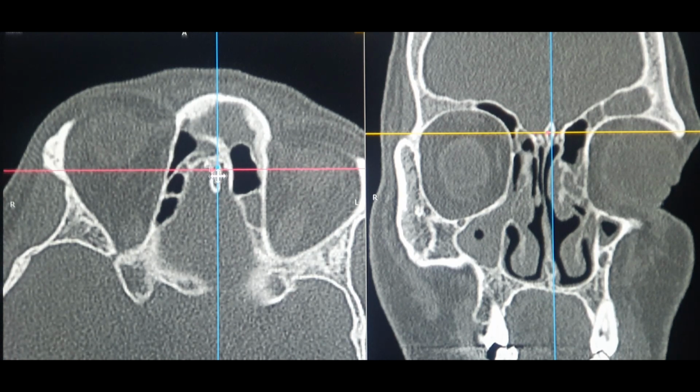As you can see, this is the crista galli area. This area anteriorly is all above the frontal sinus, the posterior table being the limit. This area will be all the anterior ethmoid and the posterior ethmoidal area, where you can see the olfactory epithelium as well, and the length of the cribriform plate. So this is what you have to remember about the crista galli for the axial scan. And if you're studying it on the coronal scan, you also have to study the Keros classification, which I have mentioned in my previous videos. So you can go and check it out.